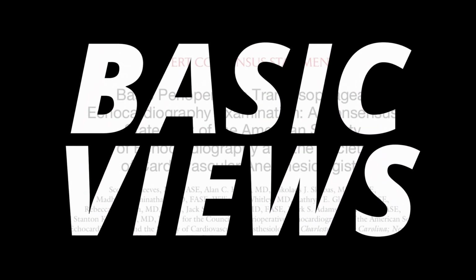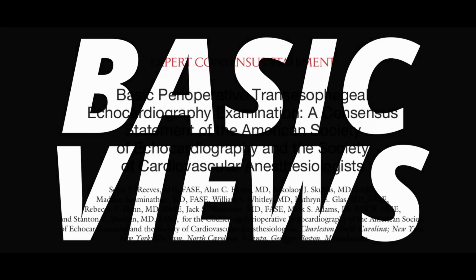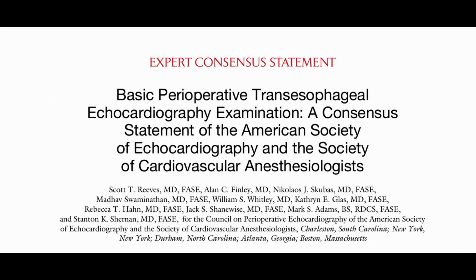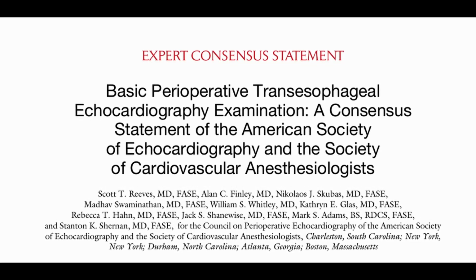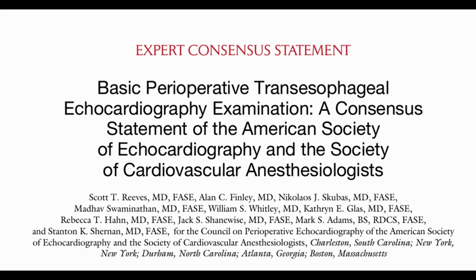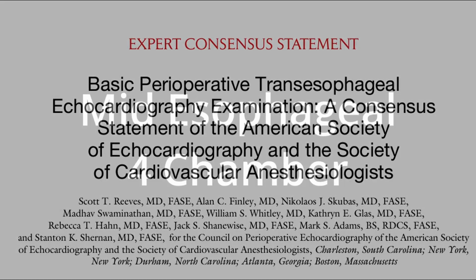This video will cover the 11 views described in the 2013 Guidelines for Basic Perioperative Transesophageal Echocardiography, as published by the American Society of Echocardiography in conjunction with the Society of Cardiovascular Anesthesiologists. This will not include a number of additional views considered to be part of a comprehensive TEE evaluation. However, it is a good starting place for basic diagnostic and hemodynamic purposes in the ICU or non-cardiac operating rooms.